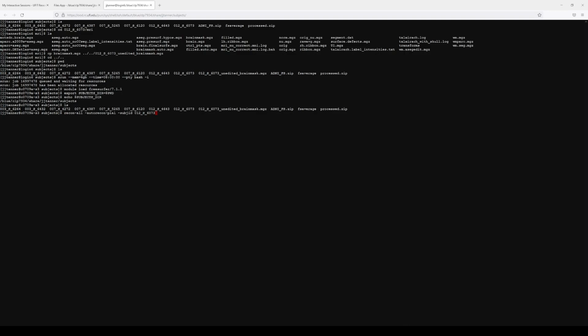And if you have your edited brain mask, it would recognize that and do the reprocessing and fix the issues. And this should be relatively quick. It could be anywhere from minutes to some hours. I would assume it's going to take some hours.